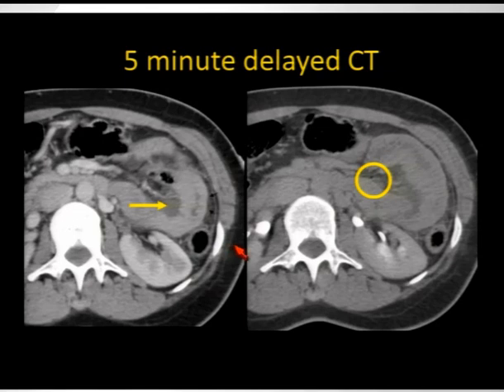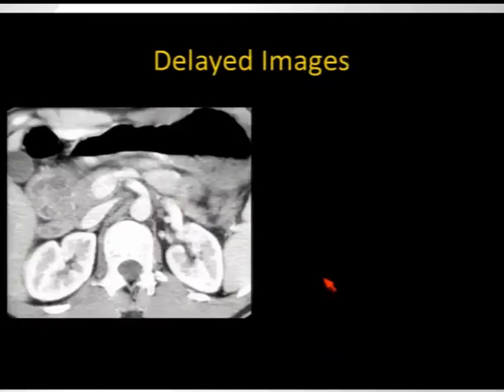So any patient who, after the evaluation of the portal venous phase images on the CT console or the PACS workstation, has any finding that may be suspicious for any injury in the abdomen, warrants a delayed phase series at about 5 to 7 minutes. And as you have seen, we use them to characterize bleeds, to detect collecting system injuries in the kidneys, but also to provide additional information of important findings, such as illustrated with this example.